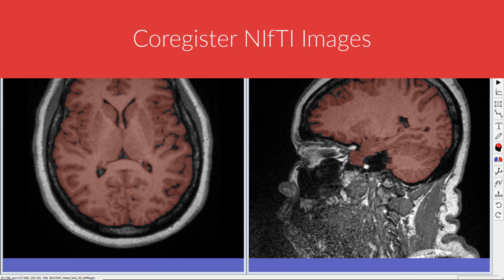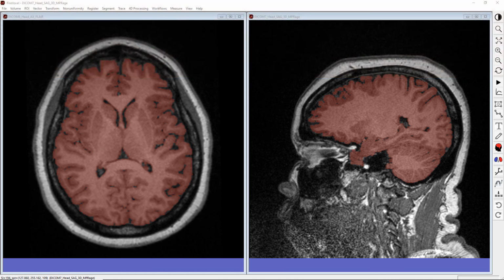Coregistration based on DICOM tags also works for CT volumes acquired within the same exam. In addition to DICOM, this command may work for the NIfTI format that can unambiguously store the image information. For simpler image formats, such as Analyze, this method does not work.